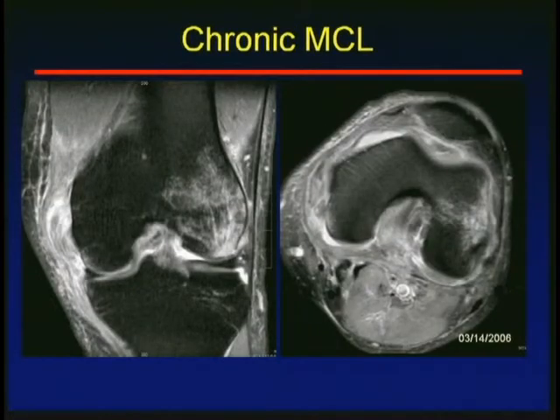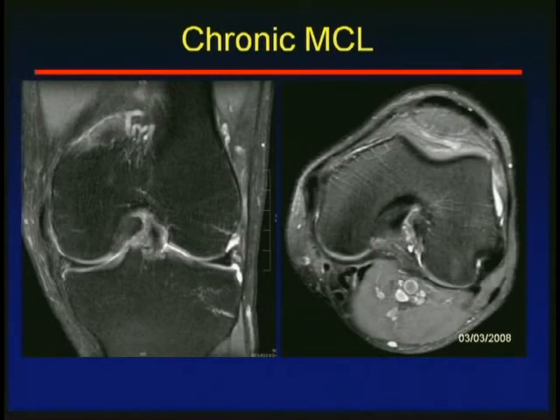Now, patients who've had MCL injury, as I mentioned earlier, despite the severity of the injury, are typically treated conservatively, at least as far as the medial soft tissues are concerned. So this is a patient at the time of acute trauma. You can see the extensive contusion on the lateral side of the articulation. The medial collateral ligament is completely disrupted all the way from front to back, and yet after some time, this ligament basically will heal spontaneously, and it is generally left with some thickening or irregularity that helps you recognize that there's been injury.